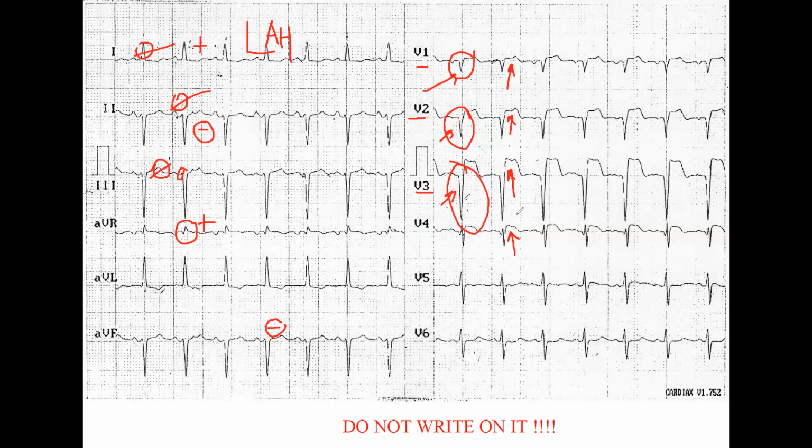But nothing else. Now still stick to the QRS complex. What can you see here? I think we see tall R waves. Or no, it's not tall. The S is too deep. All right, what does it indicate? Hypertrophy? Which one?